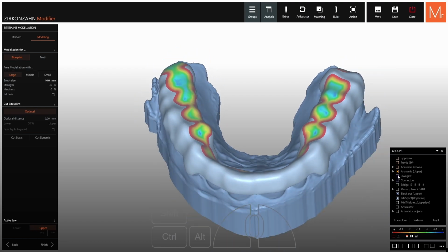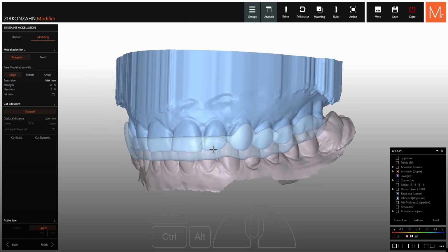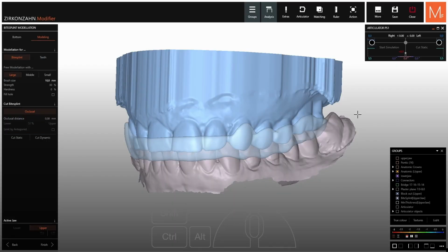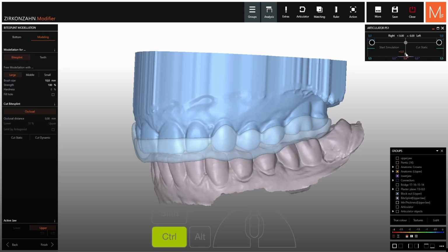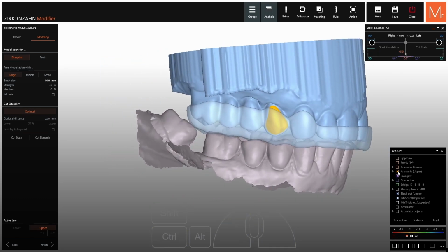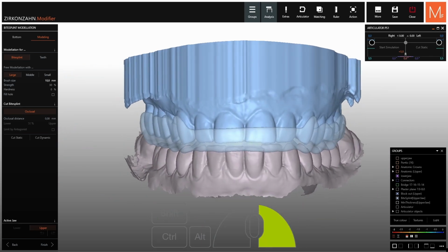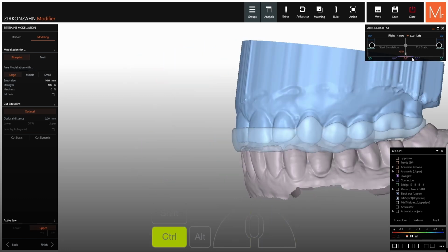However, one issue becomes apparent. The lower jaw is still in contact with the upper jaw. To create sufficient room for the bite splint, we open the articulator. You can, of course, for real clinical situations, also import the lower jaw with the correct open relation to the upper. But in this scenario, opening the articulator pin will suffice. Let's also put some medium values into our articulator table.